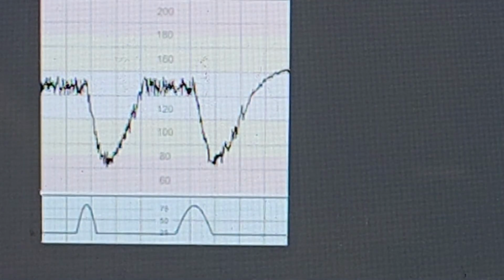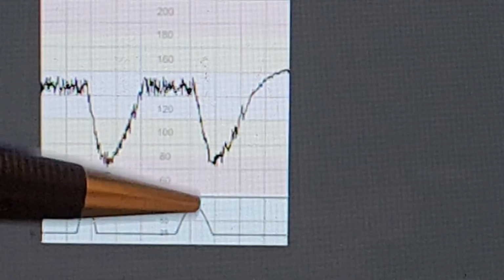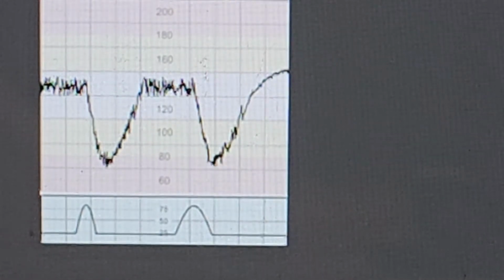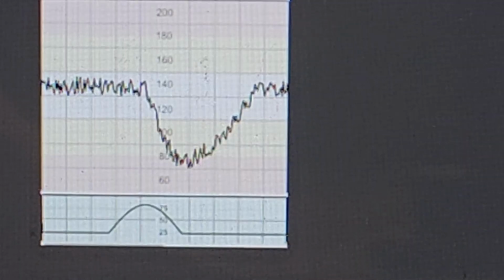So this is late deceleration, which represents, as you can see, the timing is different here, and it's not a mirror image. This is considered serious, and usually it reflects uteroplacental insufficiency, like IUGR, for example, or hypertensive disease of pregnancy. This is another good example of late decelerations.